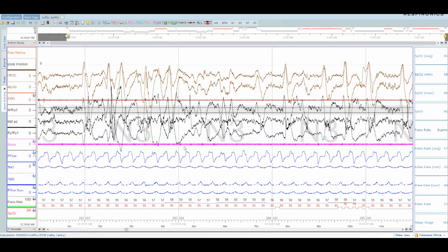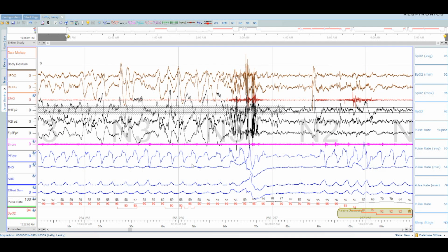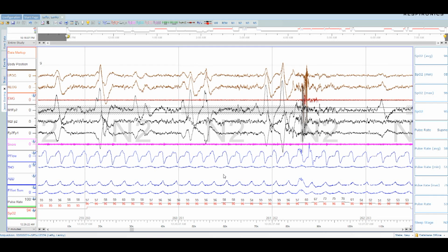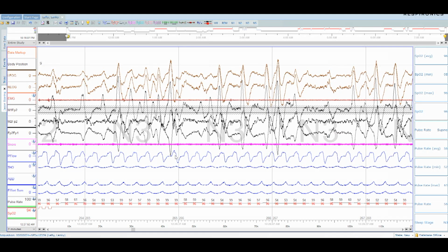A lot of delta sleep. Interesting thing about delta sleep is even people that are like severe apneics typically will have any sleep disordered breathing disappear while in delta sleep. It's kind of interesting. Now, why am I waking up so much at a delta? That's disconcerting.